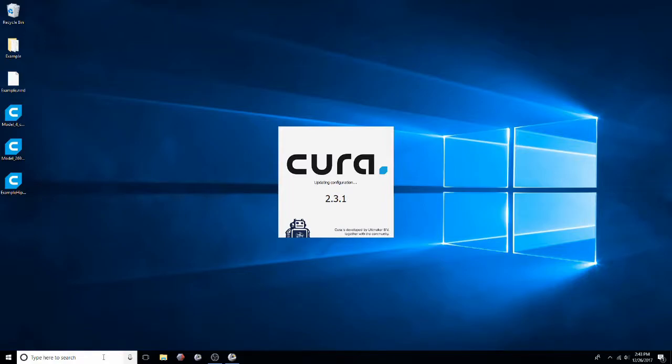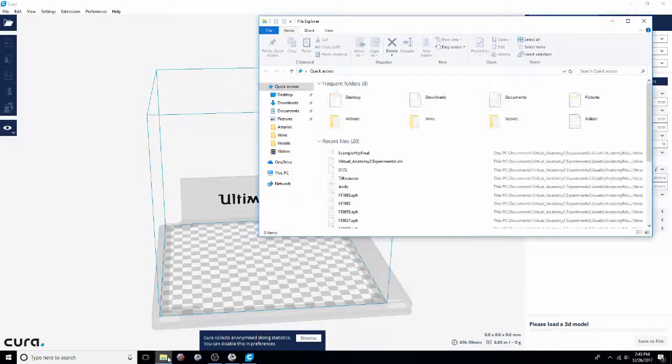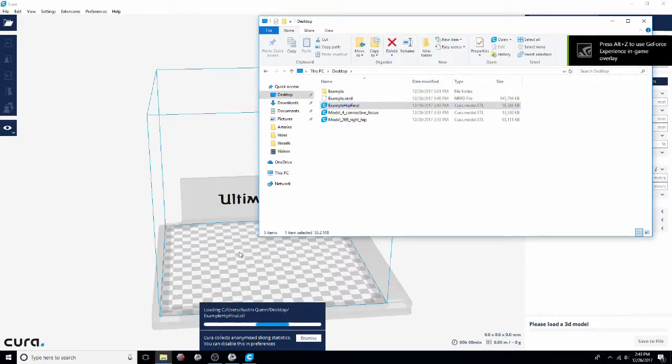So our final step, you open Cura or whatever slicer program you use for your 3D printer. Our institution uses Ultimaker machines. That means that we use Cura primarily for slicing. In most programs, though, you just drag and drop that final model, and then you'll want to make sure that it's positioned correctly on the build plate.